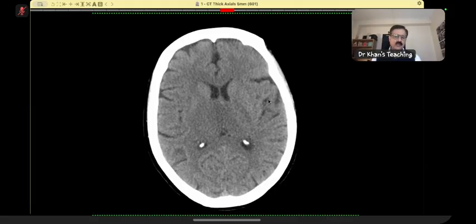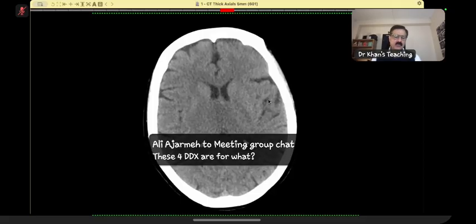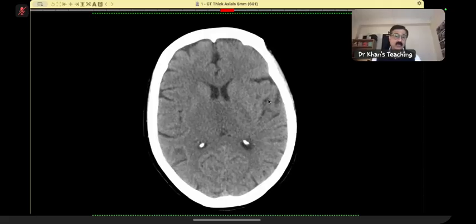The key thing to remember in gliomatosis is that it is a grade 2 astrocytoma. It is not a grade 3 or grade 4. But later on, in the final stages, within the lesion, there can be degeneration into grade 3 or grade 4. A grade 2 lesion will not enhance. Remember that. So it is a tumor which might not enhance. Of course, when it enhances, you call it.